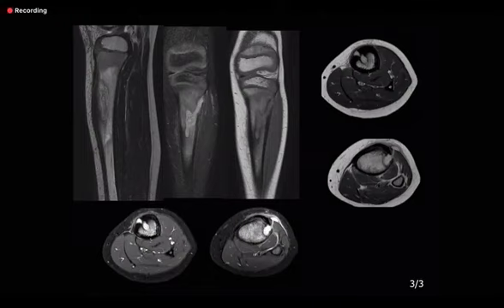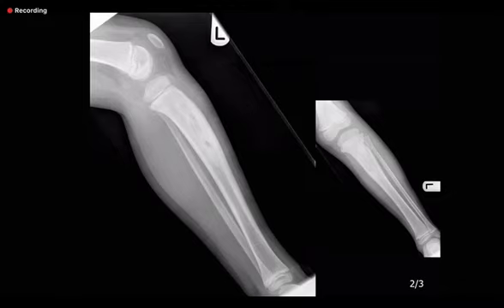So this again has characteristics of osteomyelitis. I can see cortical breach with a cloaca and cortical tunneling with a sinus tract into the muscle. So osteomyelitis. I think you got 2 or 3, how many? Osteomyelitis. So hopefully you'll get one in the exam also.